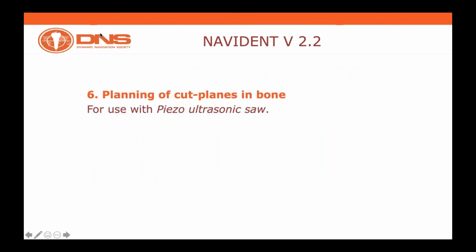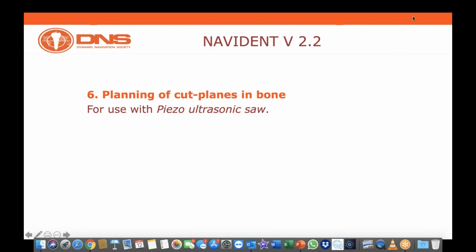Then we will talk about another important feature which is introduced, which is adding a saw cutting plane.